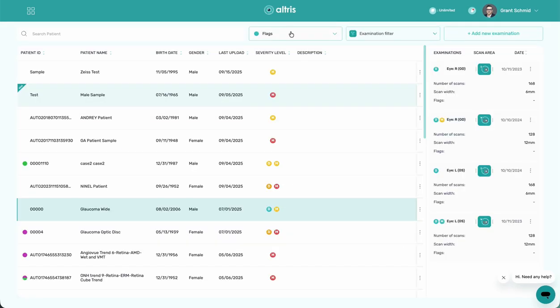You also have here at the beginning the flagging system that you'll be able to see right here with the flags, anything that's showing between biomarkers, pathologies, change. It can be used by pharma to identify clinical trial patients. It can be used by staff to look for patients that have change or for patients that might benefit from a specific treatment.